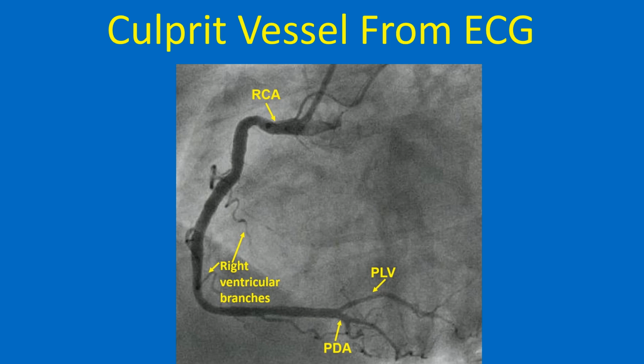If there is a proximal occlusion, inferior wall infarction is associated with right ventricular infarction. RV infarction manifests with ST elevation in right precordial leads. Right precordial ST elevation can also occur in anterior wall myocardial infarction due to left anterior descending coronary artery occlusion.